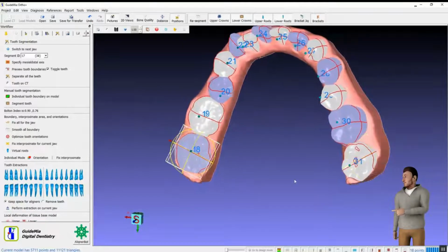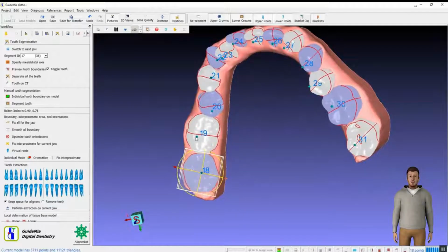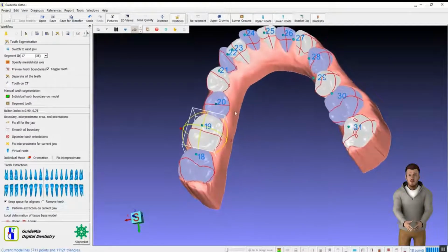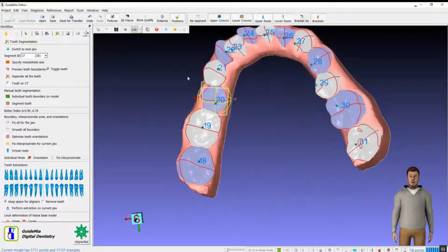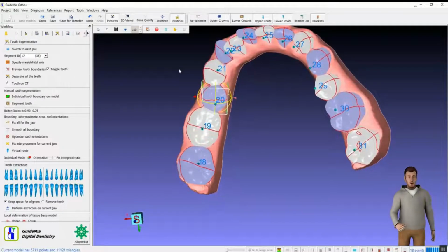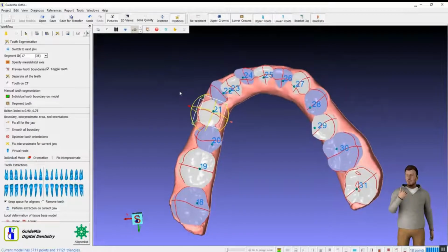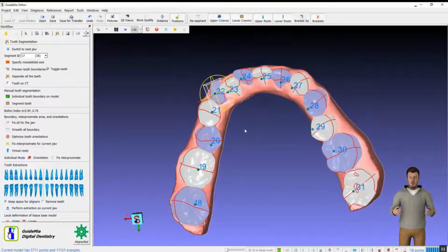Use the circle button to cut the area until we have the correct root geometry. The Finish button will then create the model, and moving to the next tooth, we will need to create the roots one by one. However, the root segmentation is optional for both jaws. We can perform this operation when all crown segmentations from optical scans are finished, or we can do this process as one step in each jaw separately. In this case we will need to switch back to the upper jaw to finish the other jaw too.